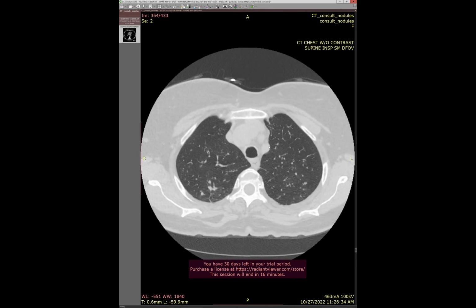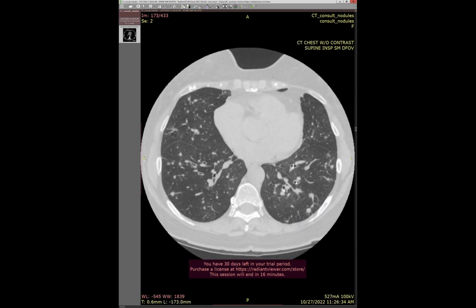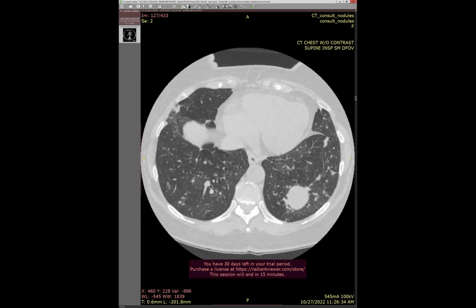Yeah, this is a case I sent to a bunch of you guys, but that we're still kind of debating what it is. So this patient has had these nodules now for many years, slowly growing. Like for instance, this nodule, which I can't remember how large it is now, but it was like 1.4 centimeters in 2014, and now I think it's 3 centimeters.